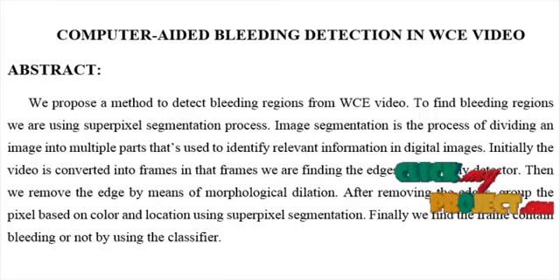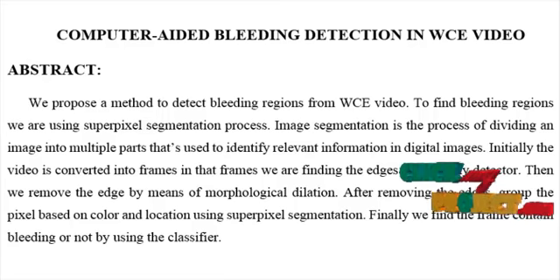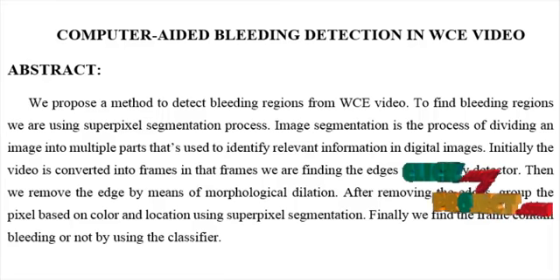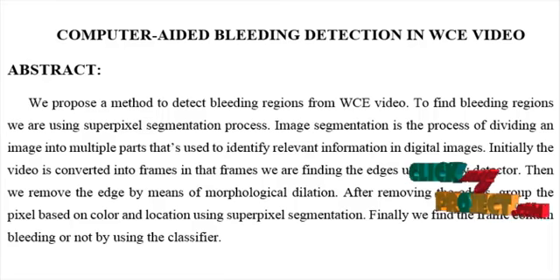After morphological dilation, seed region growing based segmentation is employed. The superpixel segmentation balances the complexities through the pixel grouping. The initial seed point is grown in order to obtain the similar pixels in the image. For this process, a particular threshold value is assigned for different video frames. The nearby regions were combined by identifying the similarities of the pixels.